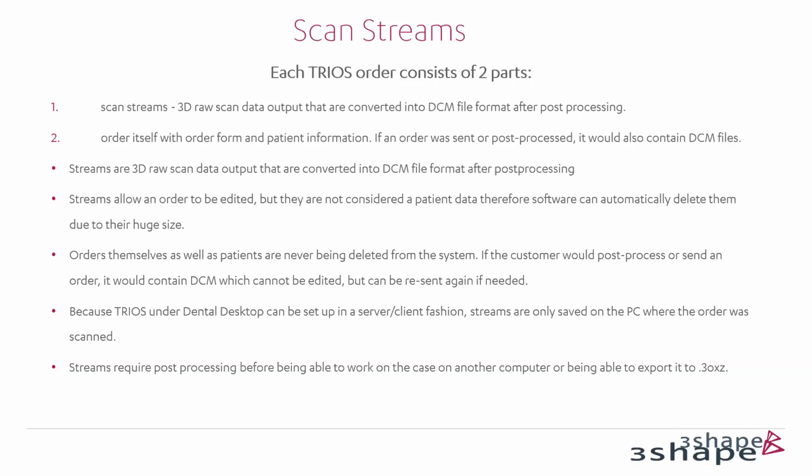For example, when our customers need to send the order to the lab, we create a new case by copying the case. We just import the streams and try to send it once again. For example, when we need to proceed with the scans import options, you should understand that streams are quite an important part of this process.